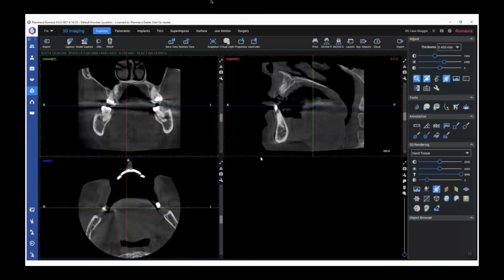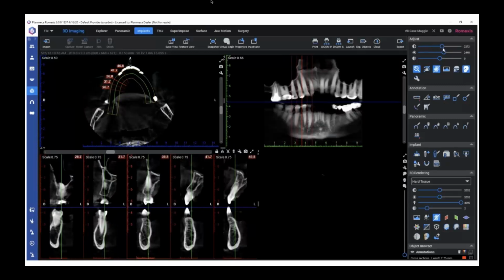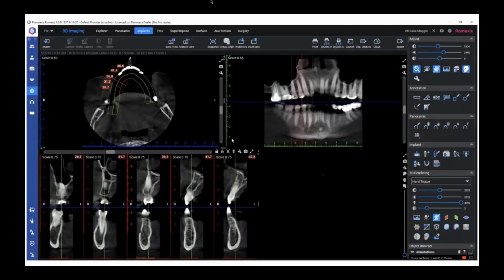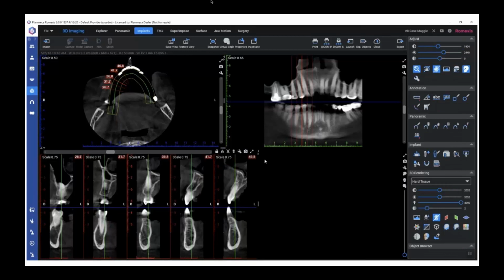First things first, we're going to capture our CBCT. We've been using the Planmeca CT scanners for years. We have a Promax Mid now that we absolutely love. We're getting exceptional quality images, but it's really nice just to have technology all within one platform. I usually skip through what we would consider the traditional anatomical views when I'm looking at a CT scan for implant planning. I will usually jump right into the implant planning tab.